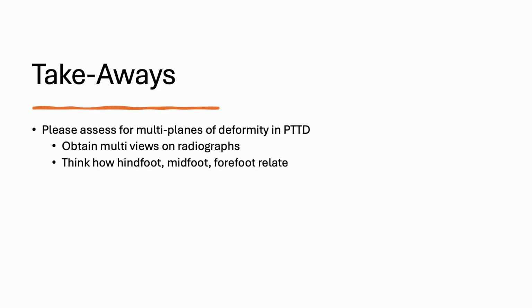Takeaways. Really, weight-bearing CT scan helps you assess in multiple planes. I think that last case really showed that. You got to see subfibular impingement. You got to see the middle facet. You got to see if there was any arthrosis. You got to see how the collapse of that medial column was, how it's going through the navicular cuneiform as well as the first tarsal-metatarsal joint.